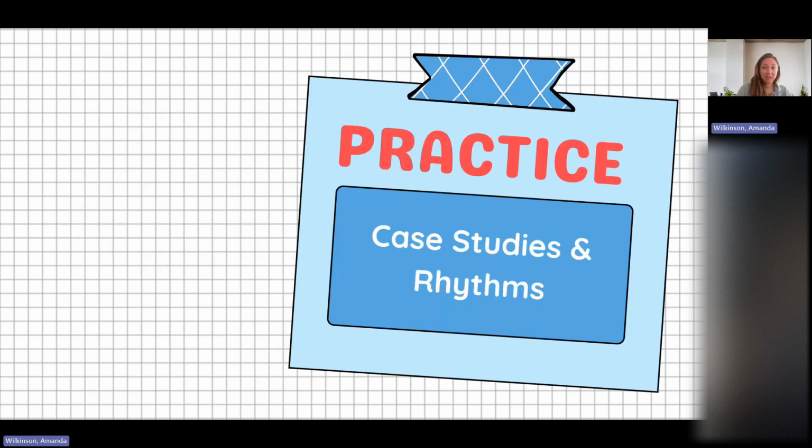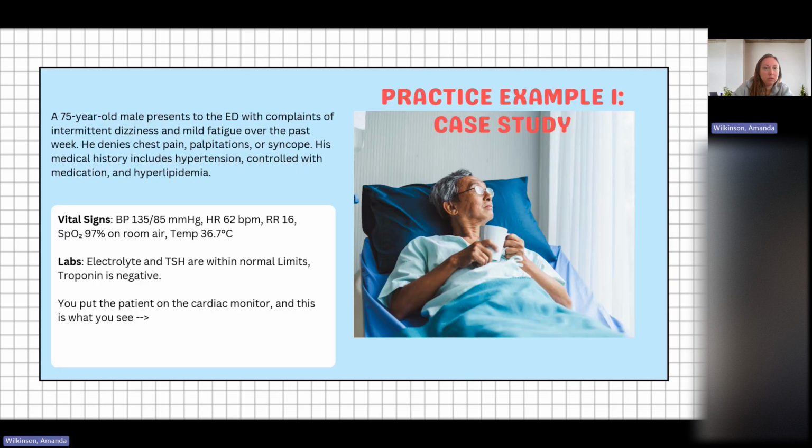You guys made it through the content. Yay. Flying through, we have some case studies in rhythms that we will go through, and we'll start with the first one. So this is super tiny. Again, feel free to unmute or type in the chat. I think Rebecca is with us for a little bit longer. Yeah, I'm here. Okay.